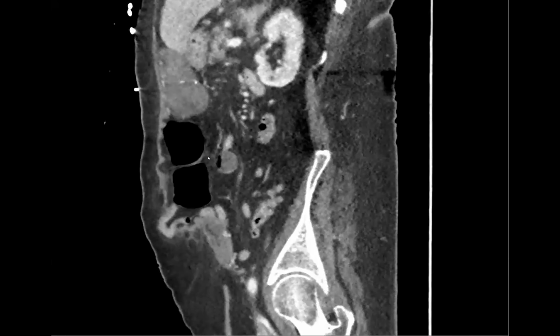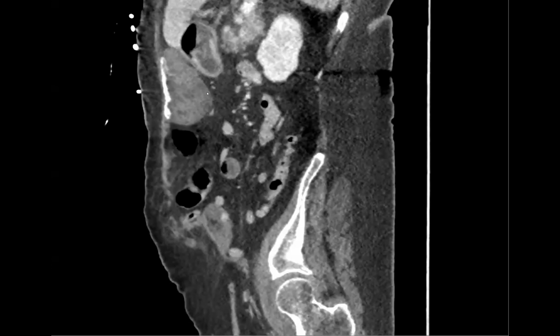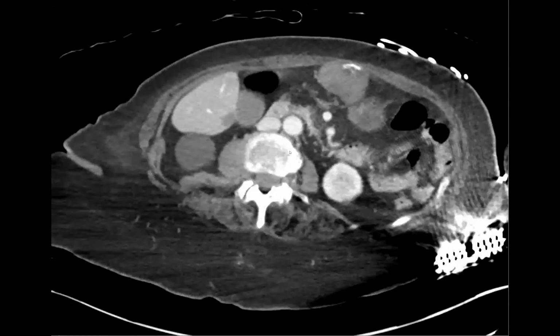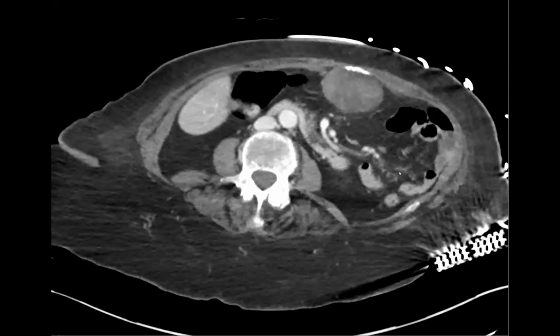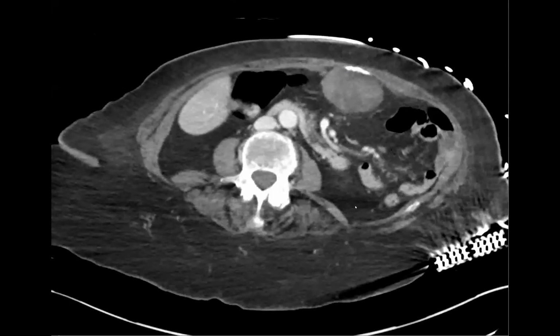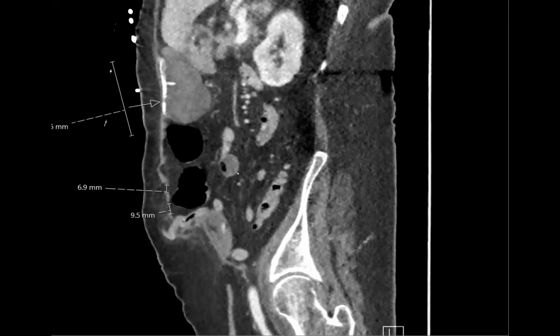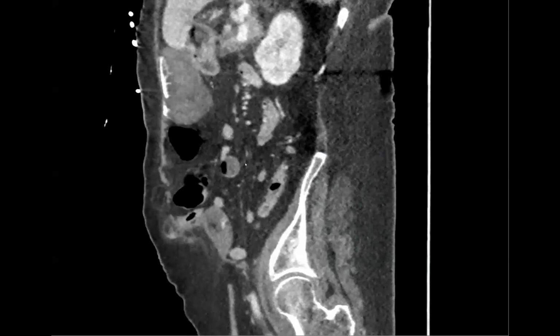Desmoid? Excellent thought. It was not a desmoid. I want you to look at this part of the mass. What does it look like if you were to put it in a different part of the body? There's almost some suggestion of fat in it, and the smudgy kind of stuff. Maybe. Well, anyway, we didn't get it. It was biopsied, and this turned out to be a myelolipoma.